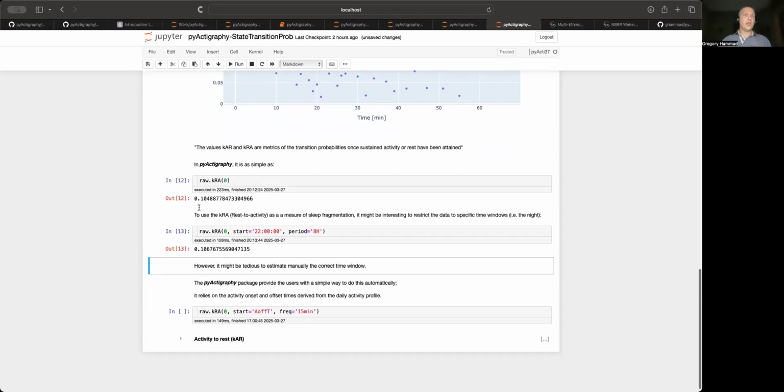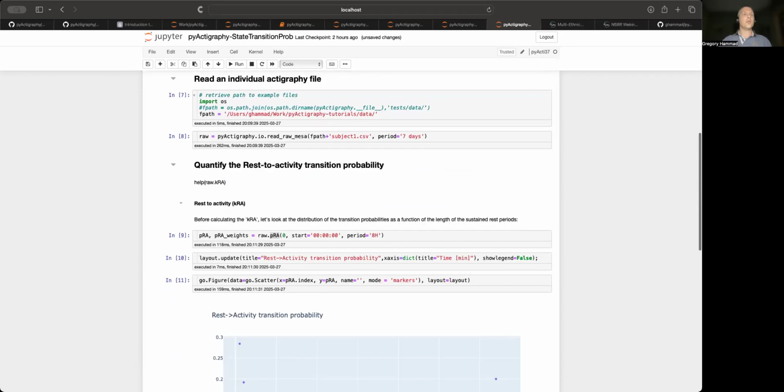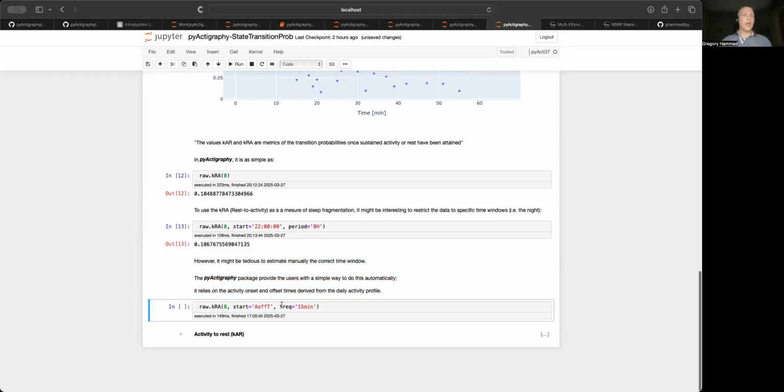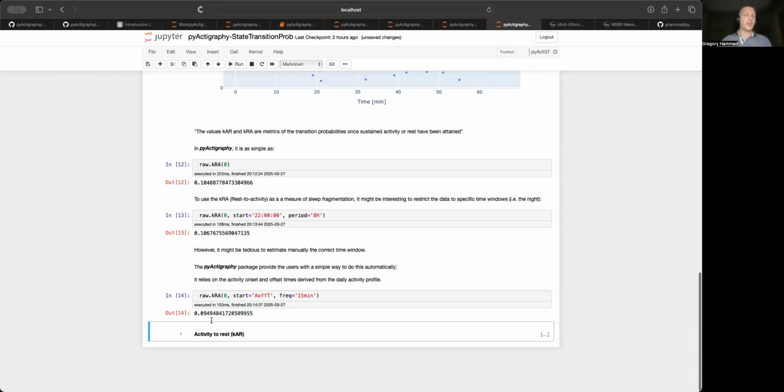And conversely, you can also look at, maybe where it is. Yes, I have it. Yes, it's there. So I won't discuss it here. There are other options here. You see the thing that I discussed so far, like the activity onset, is tailored to the participant based on this daily profile. Maybe this is because you want to target really their own rest activity. You see it does change a bit.